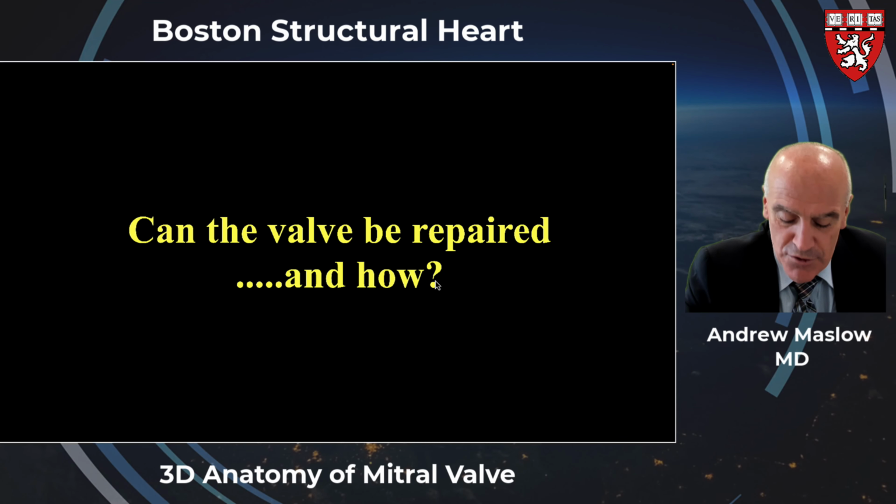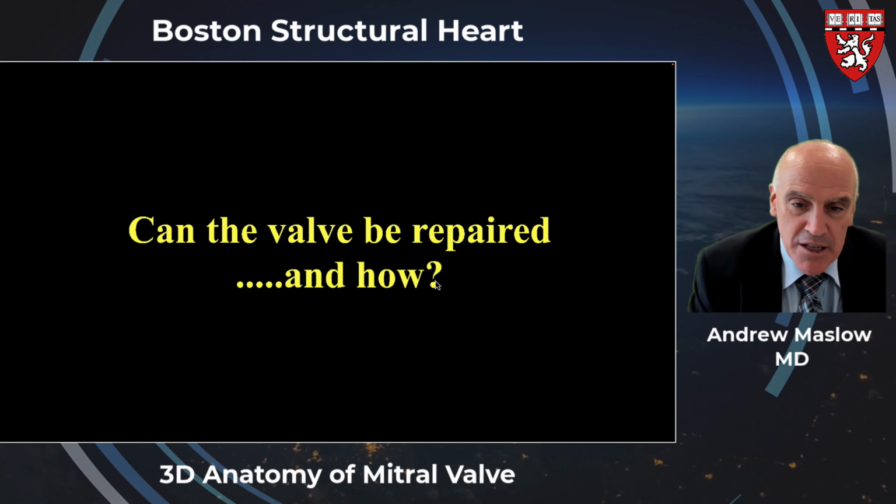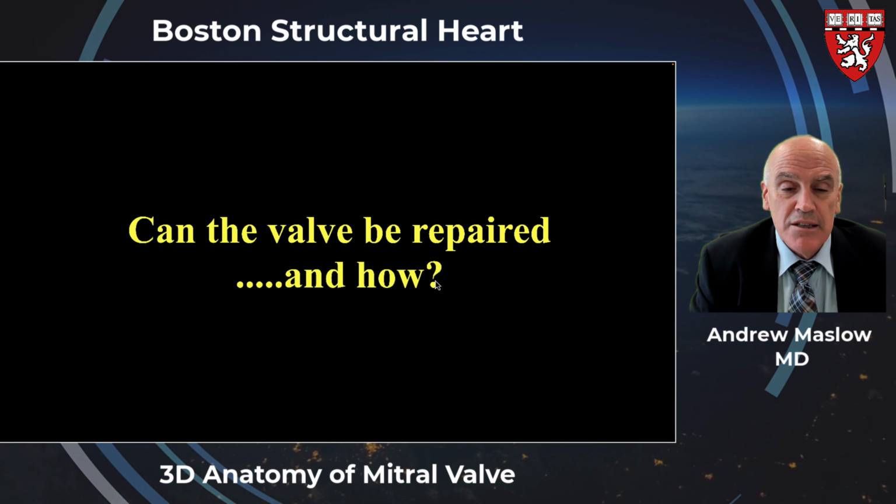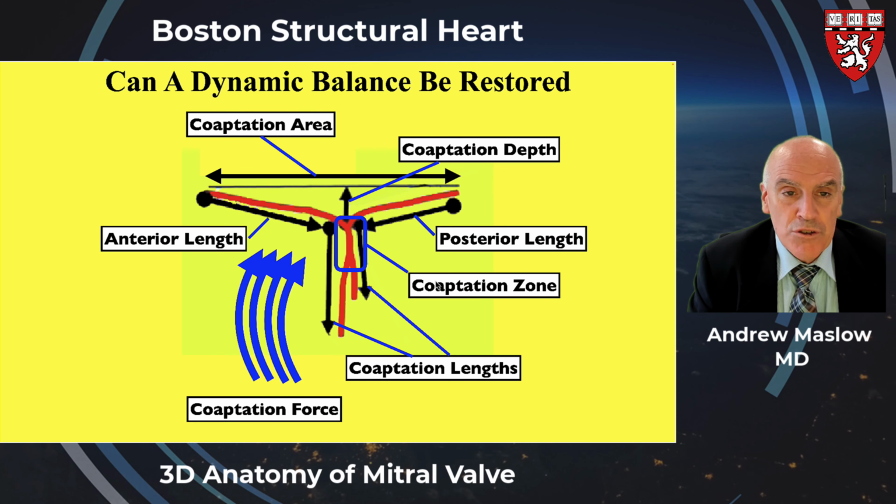So using these views, and we're not going to go extensively into it, can the valve be repaired or fixed, and perhaps how? Some of these will be for other talks, but just to give an idea, you're trying to strike a dynamic balance between the mitral valve leaflets, the annulus, chordae, as well as the ventricle and its contribution towards mitral valve function.